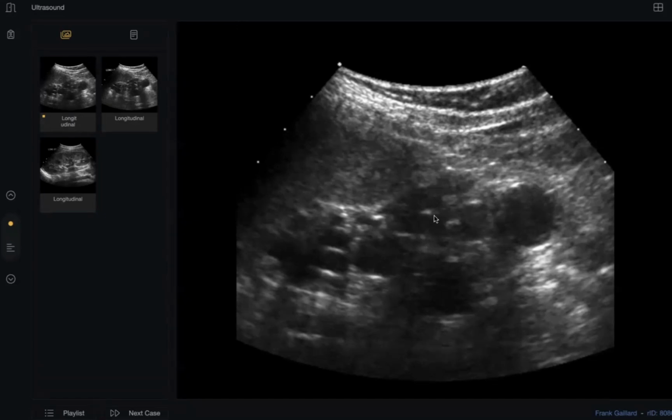Okay, this is a true calcification, but anyway. What happened? This distorted kidney with multiple cystic areas can be multicystic dysplastic kidney. Excellent. Sequelae of multicystic kidney. Okay, excellent. Great. Doctor, when you find one multicystic dysplastic kidney, what are you worried about?